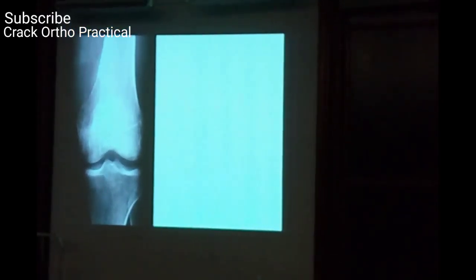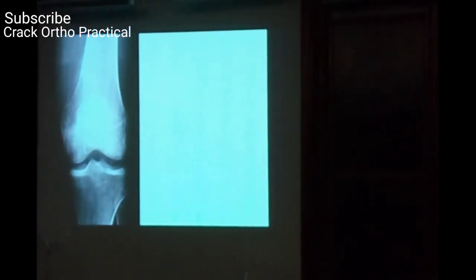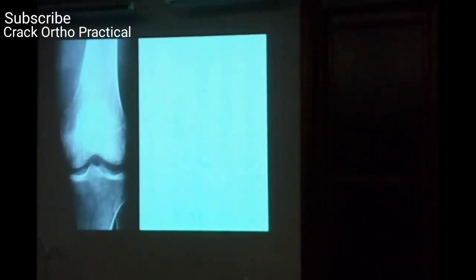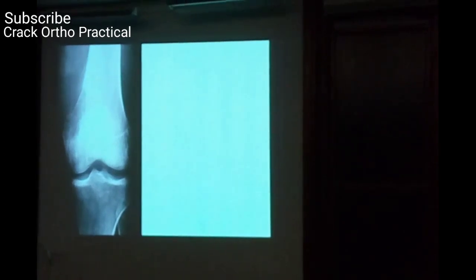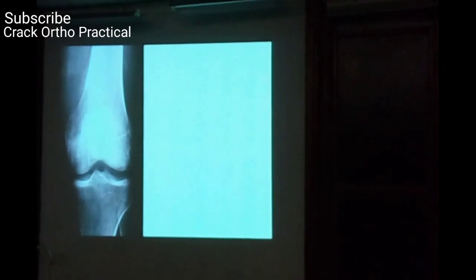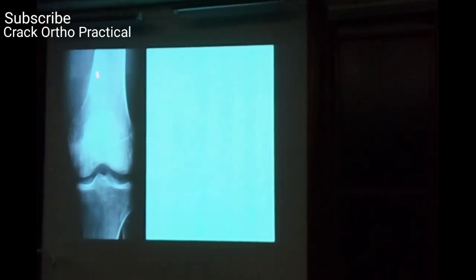Anything else you see? Periosteal reaction is there. Is it seen in GCT? It can be. Osteomyelitis, okay, I can take that diagnosis. Anything else? Osteosarcoma. Why do you say osteosarcoma? Codman triangle is seen, so this is an aggressive kind of periosteal reaction.